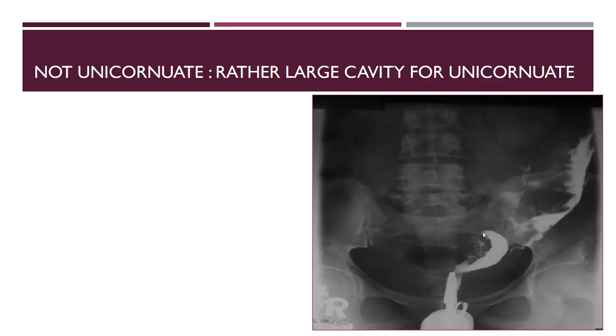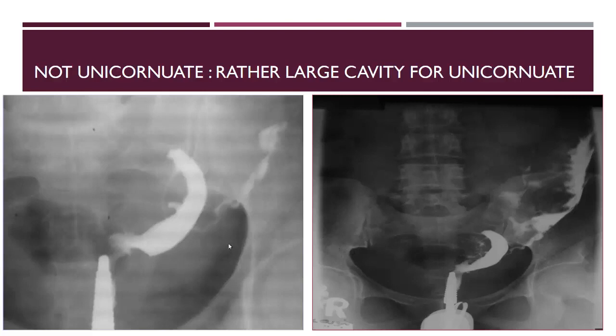But one can tell me, but we see only one fallopian tube. So there is a problem here. Why is there an abnormal contour of the uterus and it is displaced to the left? Usually the uterus is inclined to the right. So if it is displaced to the left, then this is abnormality. Again, this is the control, and this is the first serial film.